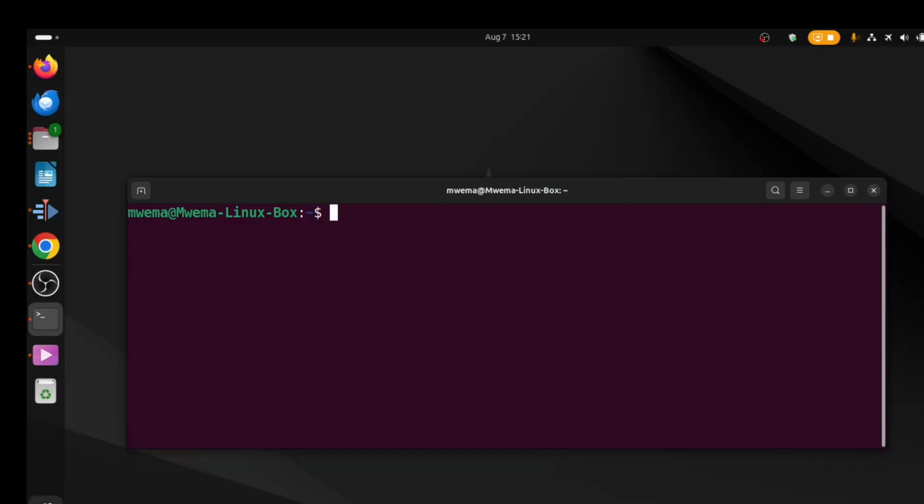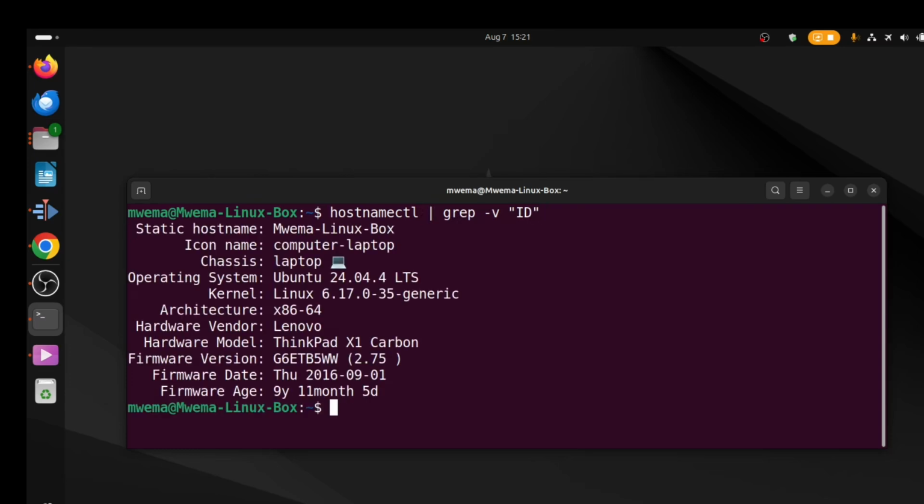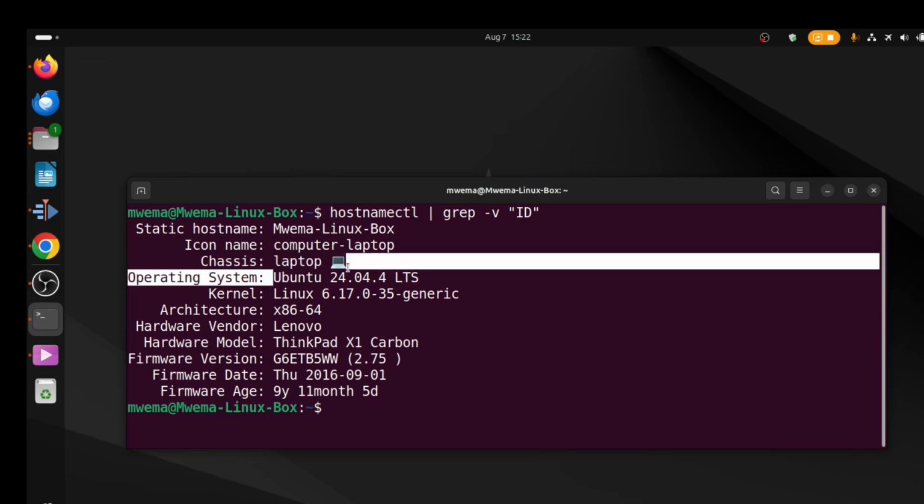I am using the same Ubuntu Linux laptop from the previous experiment. It is the same MONAI environment, the same notebook, and the same CPU-only hardware.